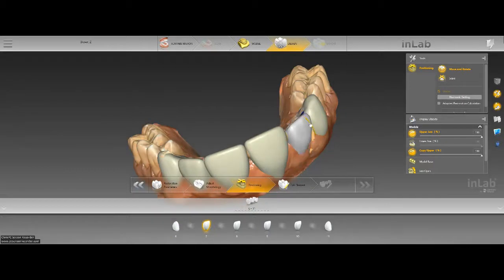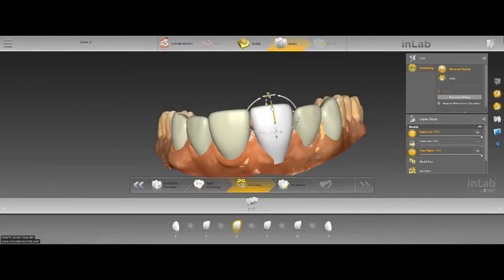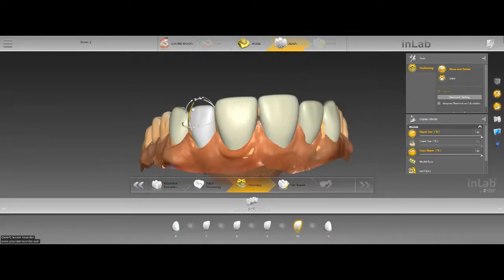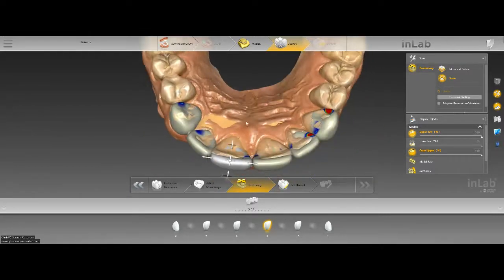We're going to go ahead and just bring our... there we go. So I'm just getting a basic general position of how I want his new teeth to look, and overall I'm pretty happy with what I see so far. Lengthen the distal and bring it slightly more lingual.